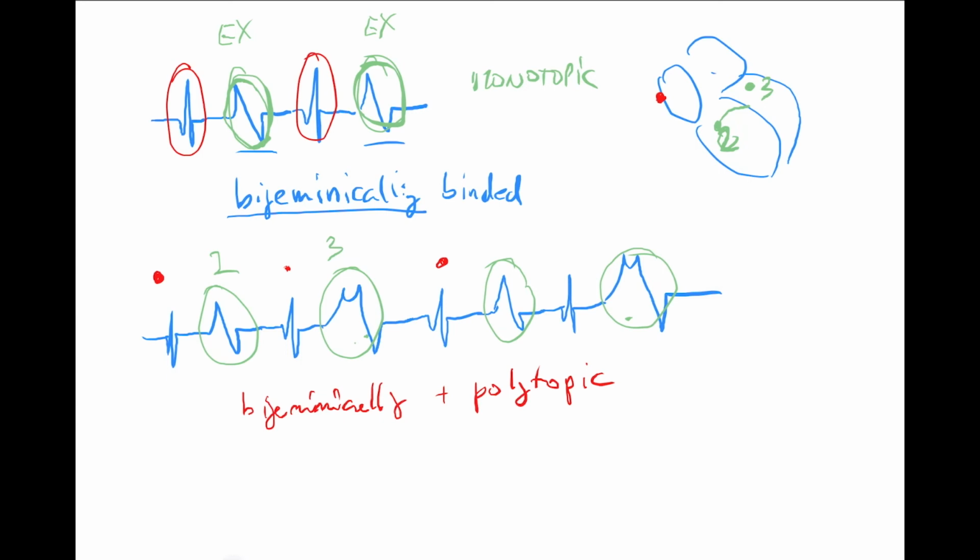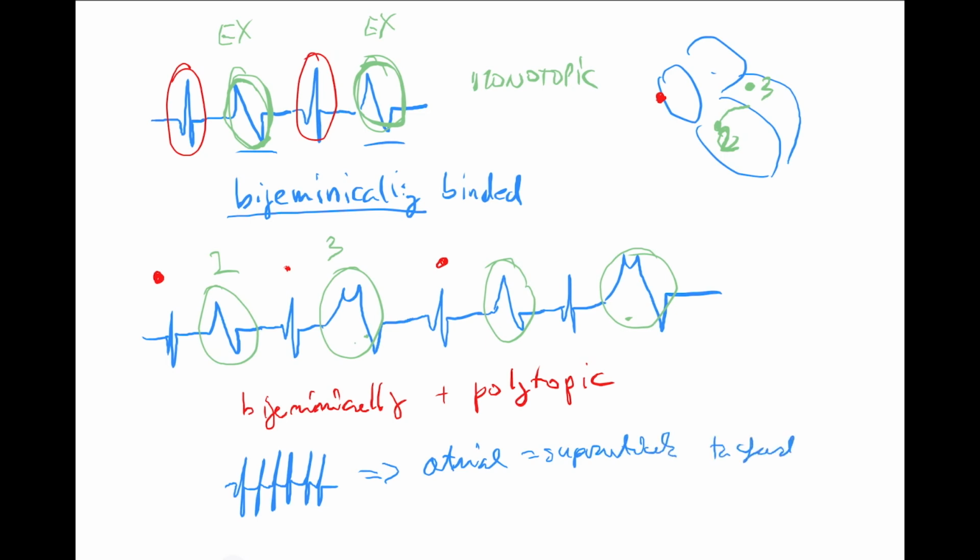And one more thing, this is an important rule. If we talk about atrial extrasystoles, and if there are 3 after each other, so they're very near and there is no P, 3 and more after each other, you call it, and we talked about it already, atrial or supraventricular tachycardia. Okay?